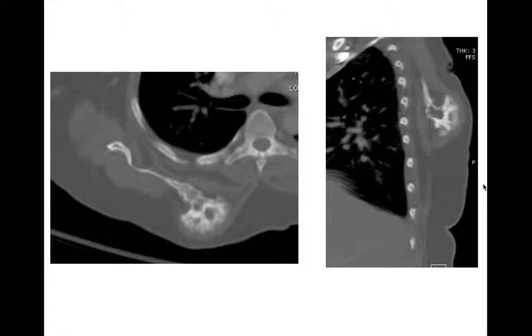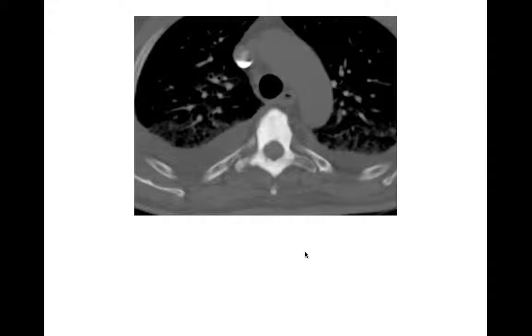degeneration. So this was a person who had multiple hereditary exostosis. They're more likely to undergo malignant degeneration. And the ones that are more likely to undergo malignant degeneration are going to be the more centrally located ones, so ones arising from the pelvis or ones coming off the scapula, for example. This was a perfectly benign one, but just an example of an osteochondroma off of the scapula.